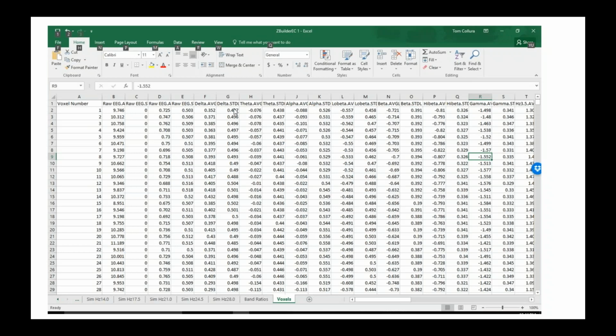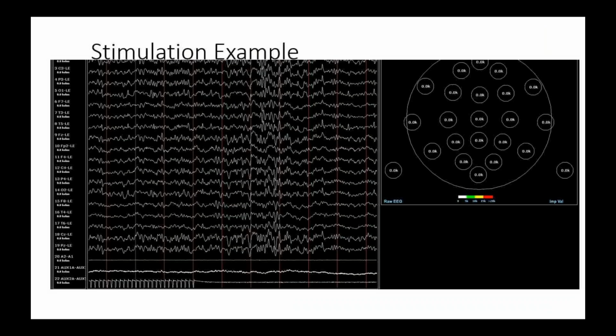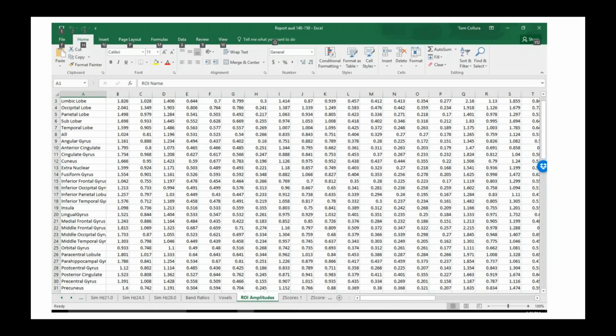And so it's showing, and these are actually logarithmic expressed so that they have all the proper qualities to be a reference database. And so we do a stimulation, and again, see on the bottom, you see all these stimulation pulses, and then they stop. And you can see in the raw EEG, you don't really see clearly the result. You might say, oh, I think I see more beta or something over here, but that's not a quantitative judgment. So this technique allows us to get quantitative information.